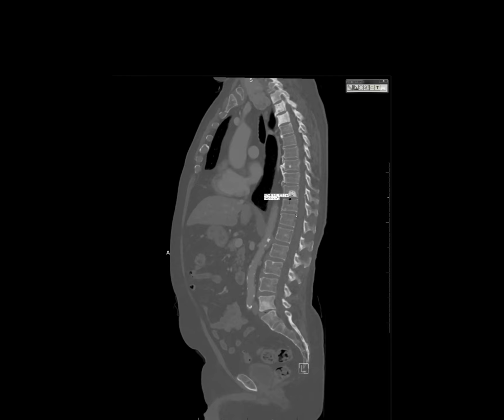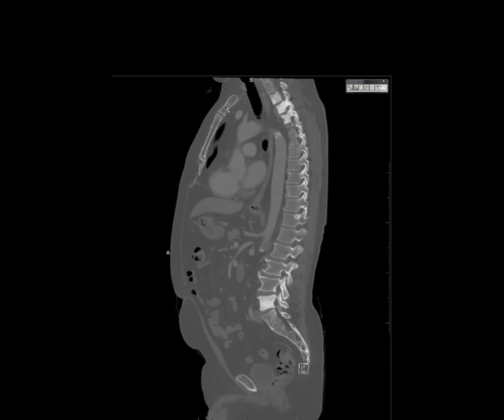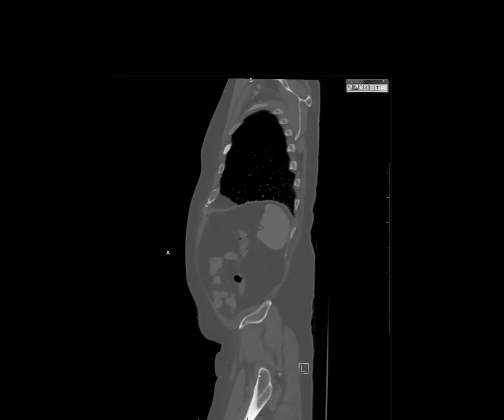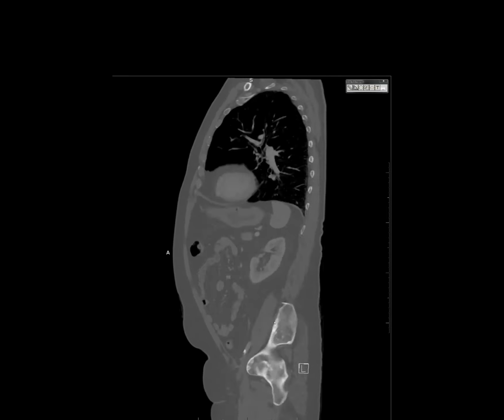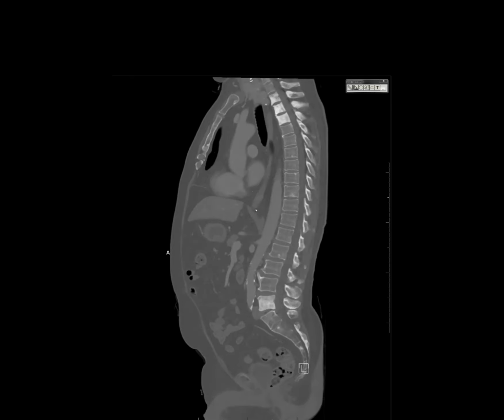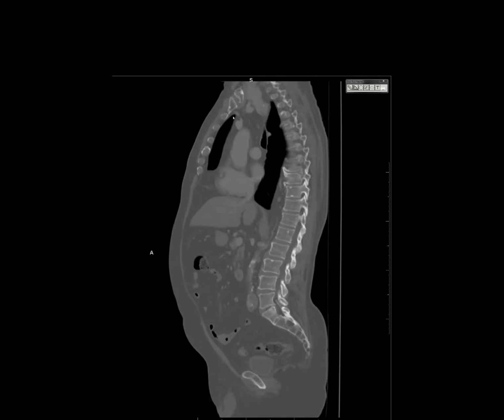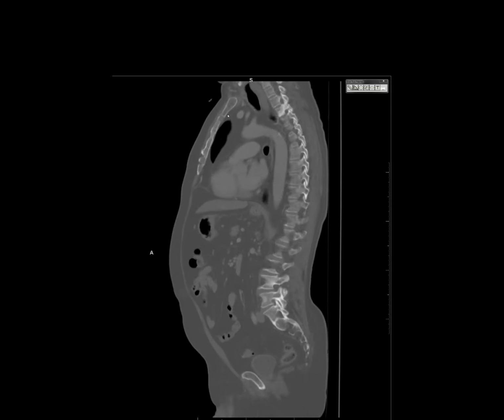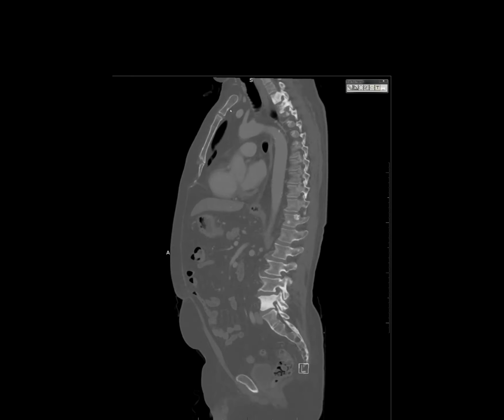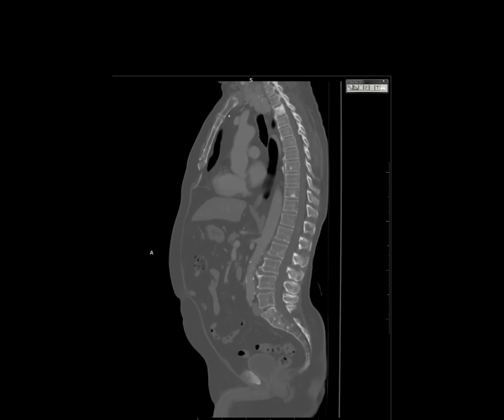In this case, if I wanted to call progression, I would start looking for the smaller bone lesions in the sternum or in just random places that you didn't catch them before. Again, looking for the small ones helps you because those are the ones that are going to be new, since they haven't been there as long. They haven't had a chance to grow as much. And so in this case, it looked like, yep, see right here. Looking at the sternum, again, looking in just random places can help you sometimes. There's a new bony lesion here, and so this would, in theory, be progression of disease.